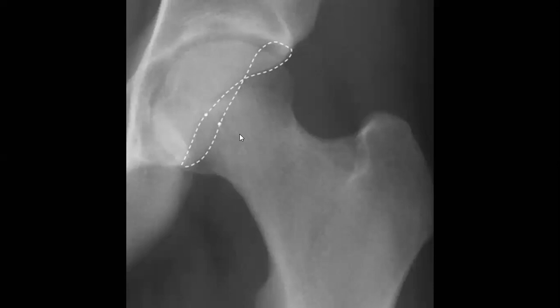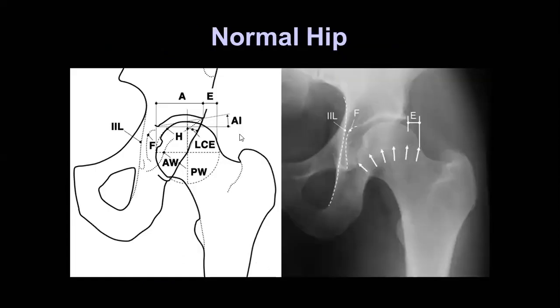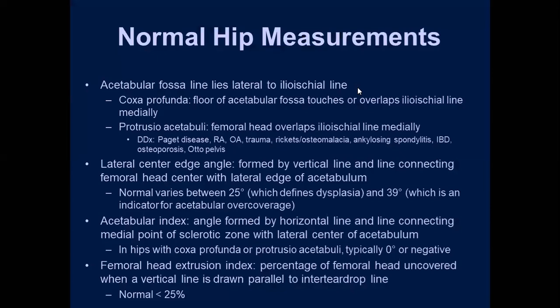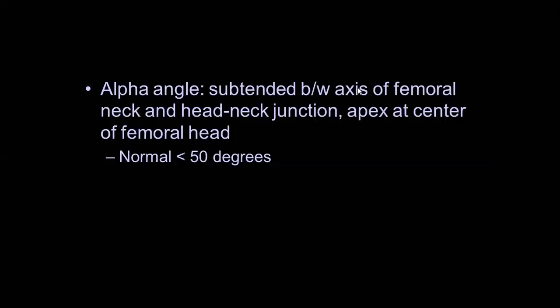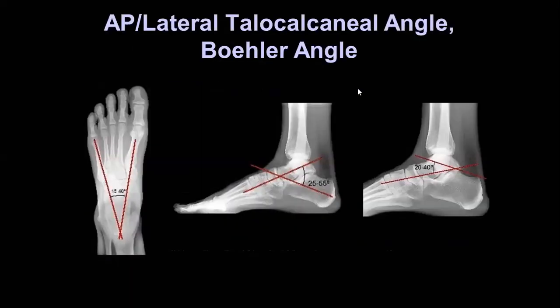Okay. And this is what's called the alpha angle. There are some details about this, but it is not our target in this presentation.